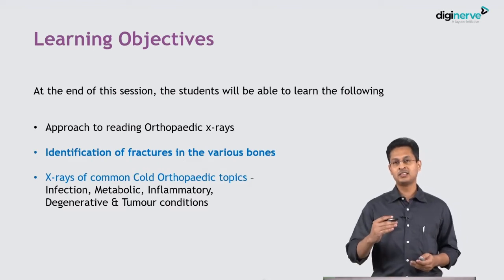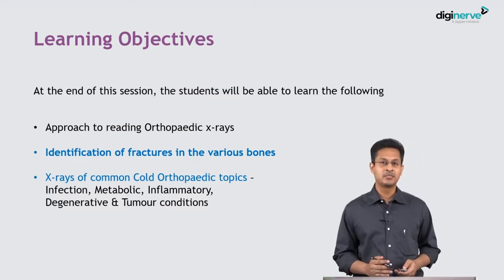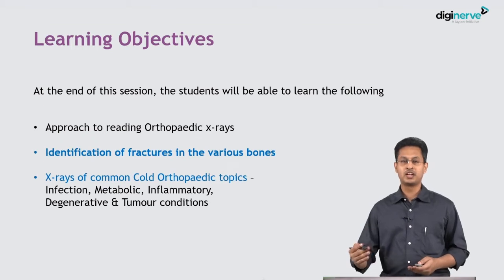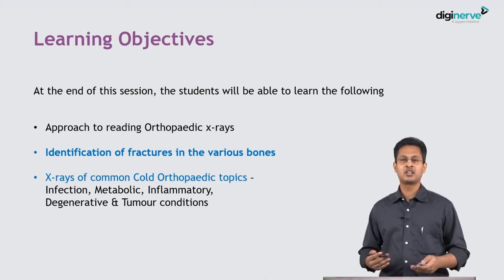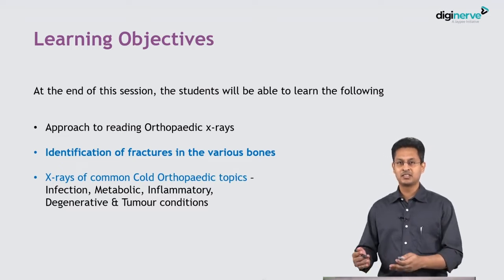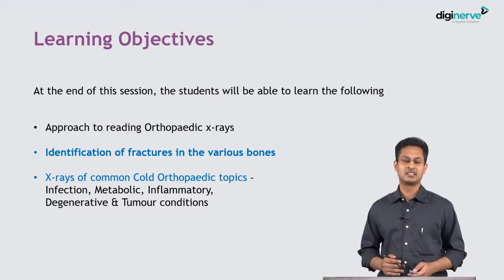So, I will be dividing this session into three parts. First, we will be covering the trauma series X-rays. I will be taking you through several examples, how to read individual X-rays, and the common or potential questions that might be asked with that X-ray or case example.